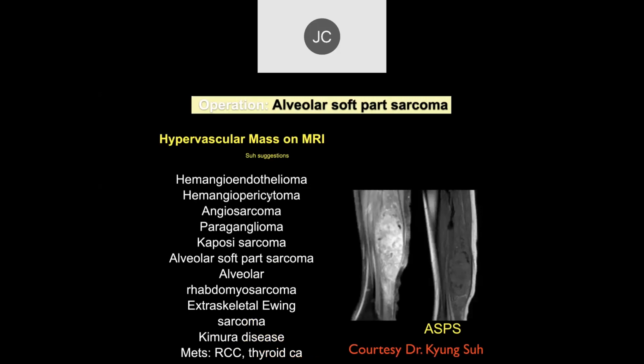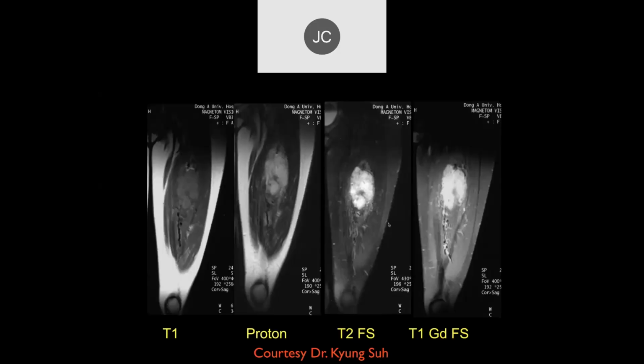Yeah. So this was an alveolar soft part sarcoma, which is a significant malignant lesion here. Once you see that it's a solid mass, the vascularity should make you very concerned that it's an aggressive solid mass. So that would put it in the category of a sarcoma. You can certainly do ultrasound and look at the flow characteristics, but I think that's a bit nonspecific. If you look at the mass itself, it really looks more like a mass rather than just a collection of tangled vessels.